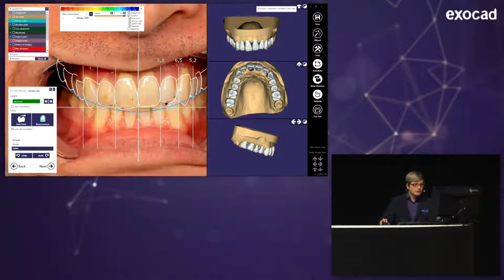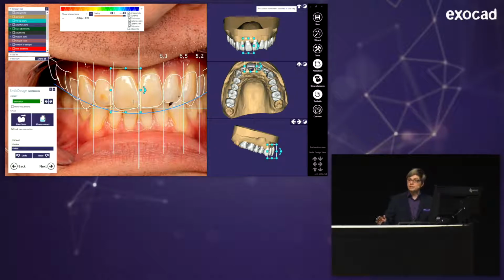And you might have realized it, but the movement function is different from the normal placement of the teeth here, in a way that you can click those outline teeth and have a box around it, which you can rotate, you can move it around, and you can actually scale it like that as well. And this is mostly because moving those outline teeth in the normal way gets a bit confusing.